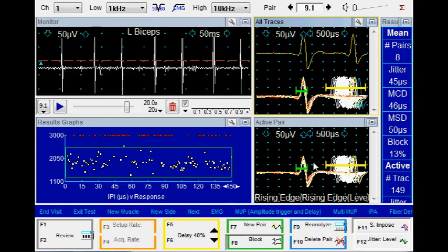We also talked about the magic rectangle that allows us to exclude potentials coming from other motor units. And we have simple rules for studying the block potentials. Any blocking that occurs with normal jitter is rejected automatically, but the operator always has full control on declaring whether the recording contains blocks or not. So using these simple strategies, jitter analysis on the Viking system is very fast and efficient, and in many laboratories it is possible to perform jitter analysis online.